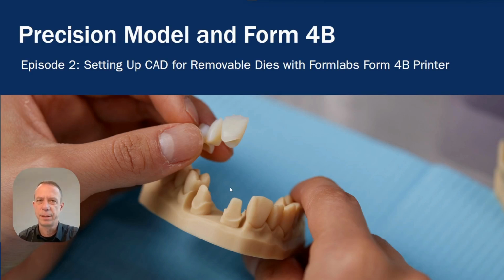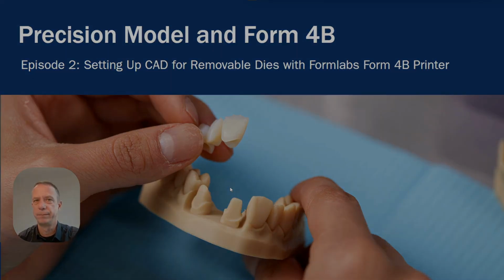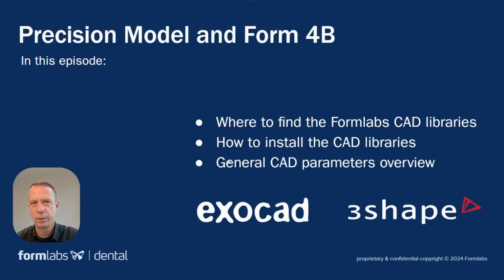I'm a Master Dental Technician at Formlabs Dental, and in this second episode I'm going to show you how to set up your CAD software. What we're going to see in this video is where to find the CAD libraries. Then I'm going to show you live how to install them correctly. And at the end of this episode, we're going to see some general recommendations for CAD design and CAD parameters in case you don't have access to exocad or 3Shape.